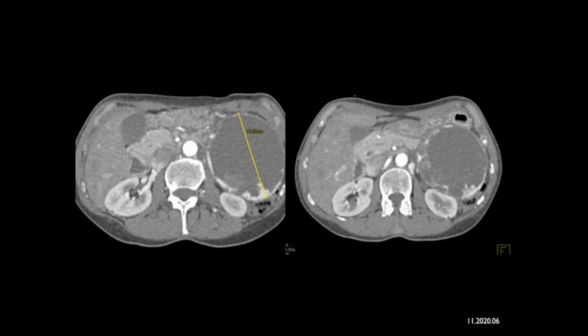Could be a neuroendocrine tumor. That's a good possibility, very vascular. Serous cystadenomas can be vascular, compressed vessels, and be cystic, obviously they are. And mucinous cystic neoplasms can be cystic and large, great location, but a little bit too much enhancement.